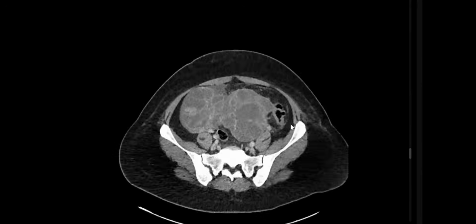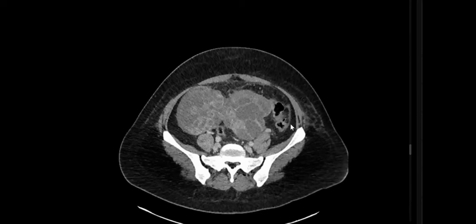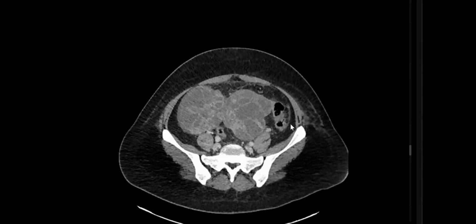You reached the last cut? No, sir. As I scroll down. Very important, I know, but very important in the exam. Even the last cut, if normal, you have to go to the last cut. It's important in the exam because sometimes in a female pelvis, you may find a vaginal wall cyst, and this may represent the main complaint in an acute patient, for example. So you have to look at the last cut. Okay, what do you see here?